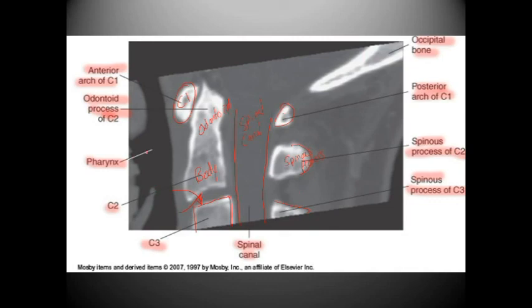Also, we have the pharynx. We have the epiglottis. I do believe that is it for that image as well.